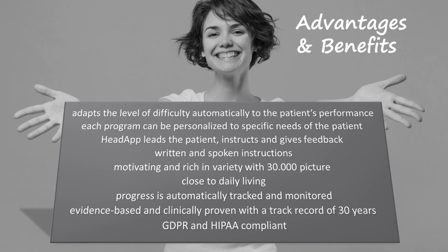HeadApp leads the patient, instructs and gives feedback. The instructions are available written and spoken. The content is motivating and rich in variety with more than 30,000 pictures. The system offers content close to daily living and the progress is automatically tracked and monitored. HeadApp is evidence-based and clinically proven with a track record of 30 years. And finally, it is GDPR and HIPAA compliant.